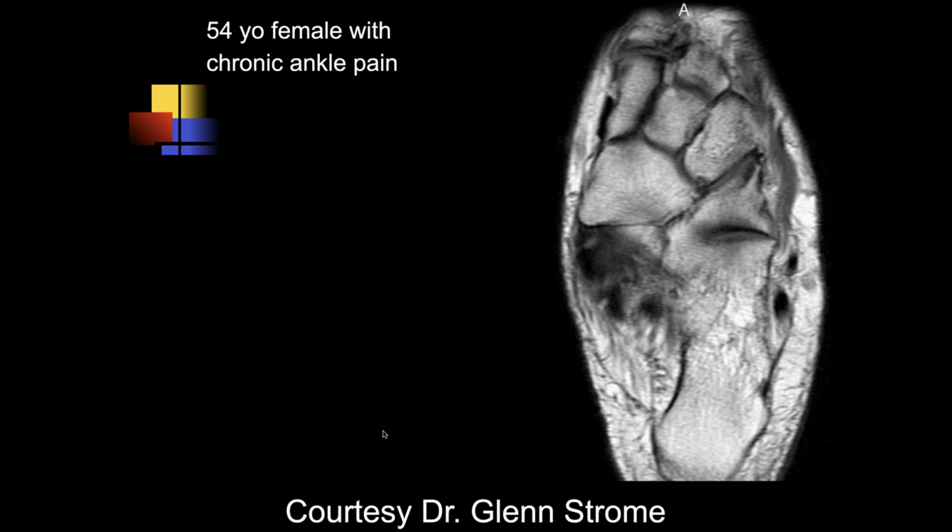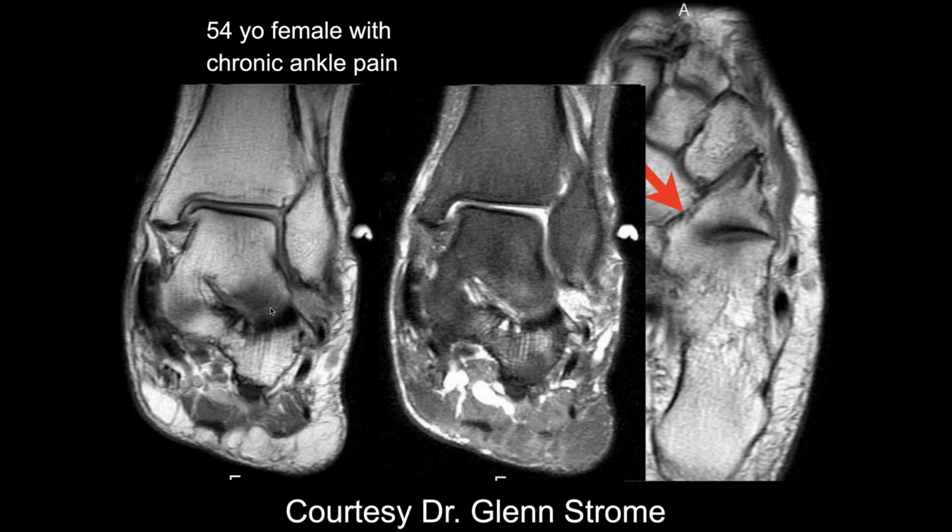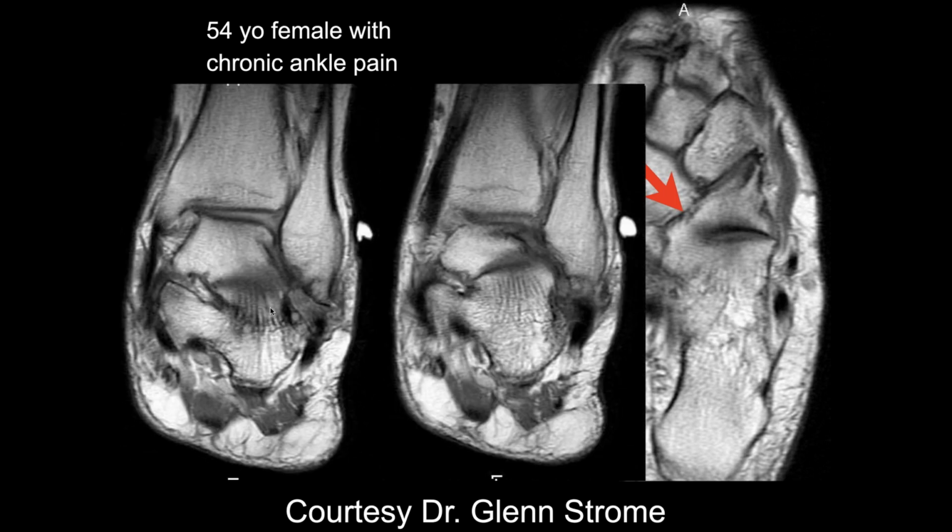Okay. Michael. Okay, so here we see abnormal bony bridging between the distal calcaneus and the cuboid. So this would be bony coalition. And then we see secondary degenerative changes occurring in the subtalar joint as well. Yeah. Like pretty marked secondary degenerative changes. And a lot of lateral impingement here.